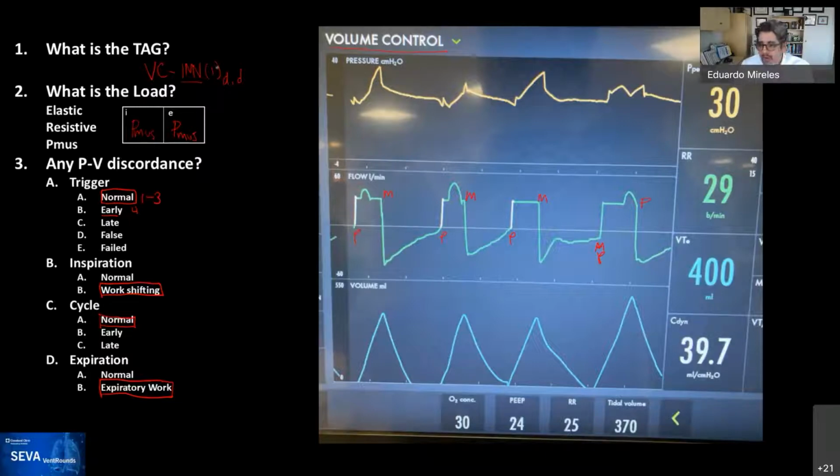And so the type, as Mohammed Megri wrote, is a type 4. And the type 4 is particular only to this mode of mechanical ventilation, in which if the breath is triggered by the patient and the inspiratory time is cycled by the patient, that single breath becomes spontaneous. That's why it just happens on this mode of mechanical ventilation. So DD means dual. And so let's talk a little bit about that dual behavior.